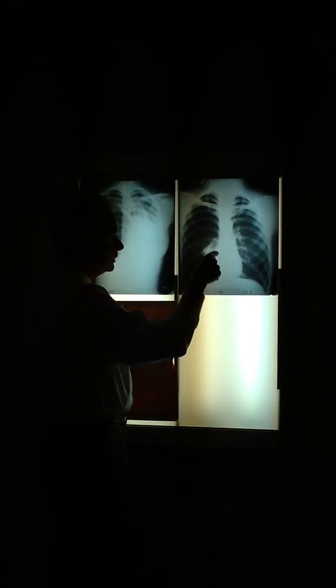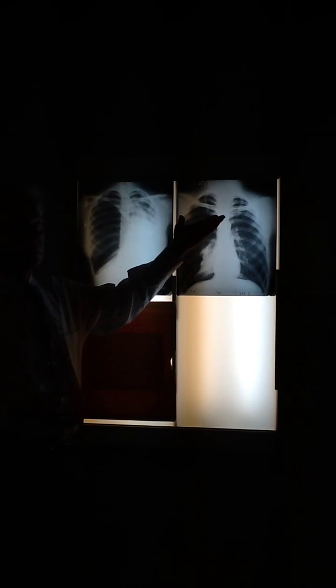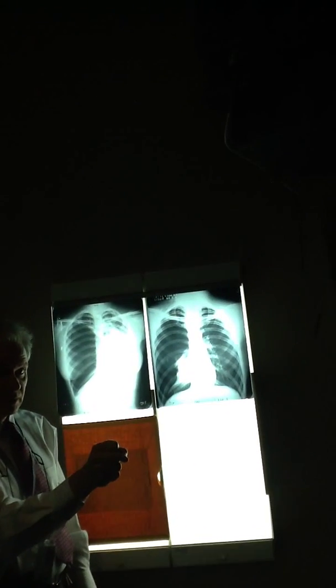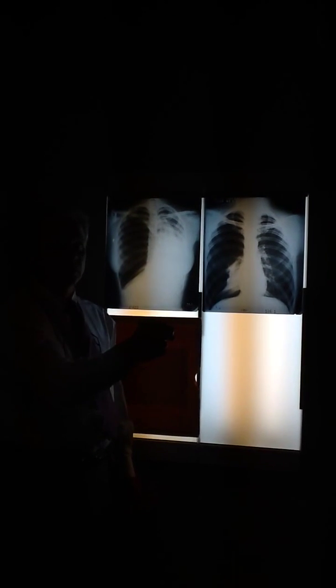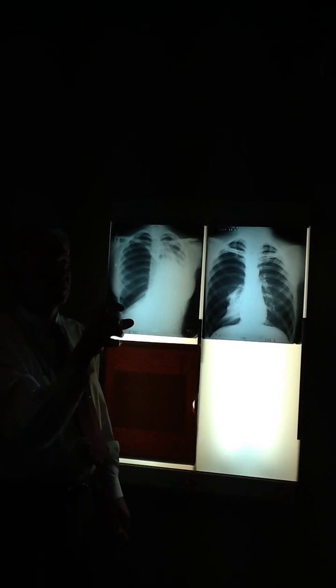So this is the lung. This is what's left of the entire right lung, all three lobes. There's nothing wrong with the bronchus. This is taking our water bottle and squeezing it. That's what happened here. Now we lost the volume. This is putting your mouth over the water bottle and sucking on it. The thing collapses. This is just externally squeezing it. And you can squeeze it with air, you can squeeze it with water, or you can squeeze it with scar.